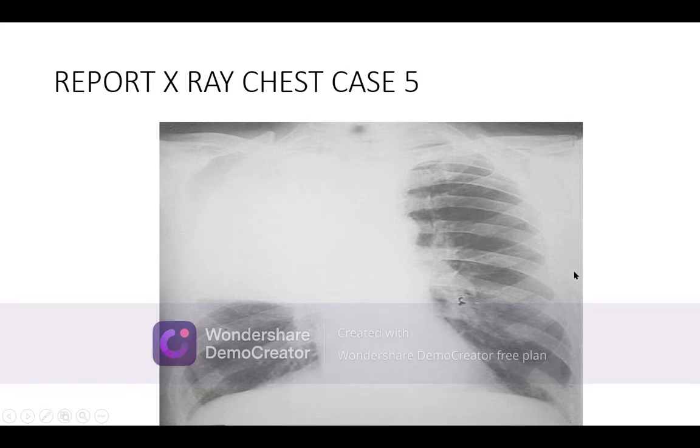The scapula, the medial border should be marked. Here it is buried in this opacity. Here it is in here. So it's all right. It means there is nothing. The spinous processes or the vertebral column is this, and there is no cervical rib which is seen here. No accessory rib. Soft tissue shadow around it, here, here, here, and here, and here. Nothing significant.